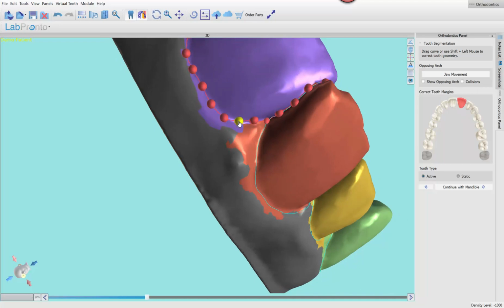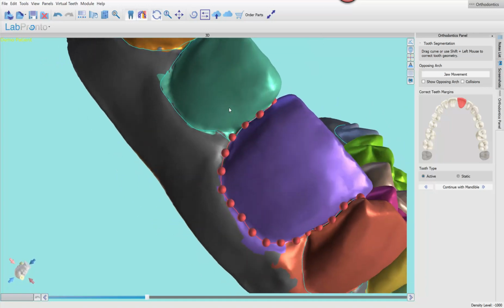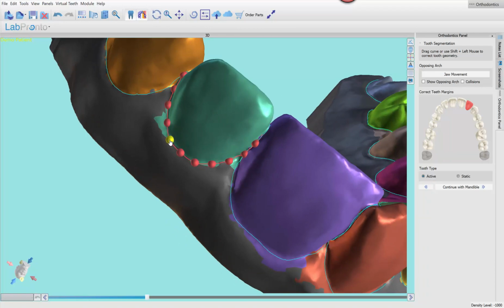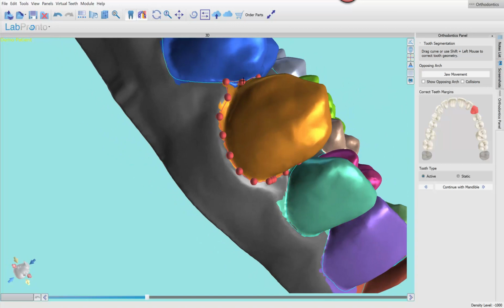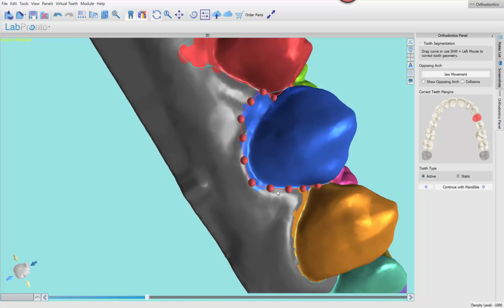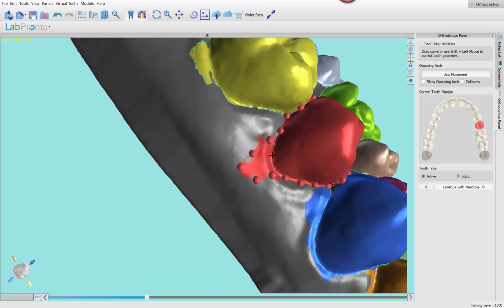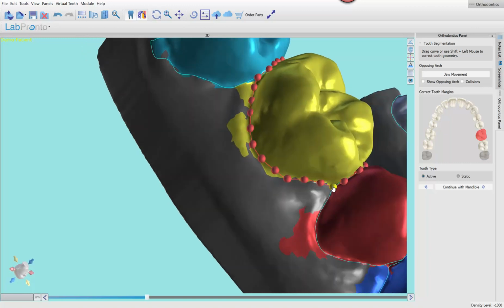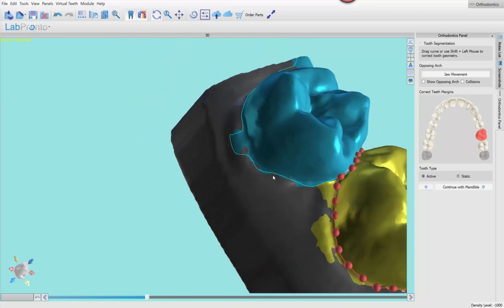As you're drawing these lines, if it falls slightly in the tissue, slightly in the tooth, whatever, it's not a big deal. If I had to pick, I would rather it fall in the tissue more than the tooth. But truth be told, neither one is going to be a big issue, because we're not talking about crown margins where you need to be accurate within a tenth of a millimeter. We're talking about flexible plastic retainers. So you've got quite a bit more, no pun intended, flexibility. Plus, we're looking at the general alignment of all the teeth, as opposed to the finest little detail of a margin.